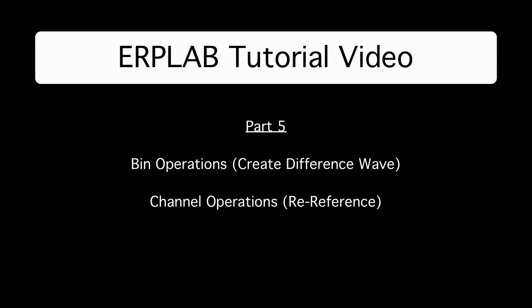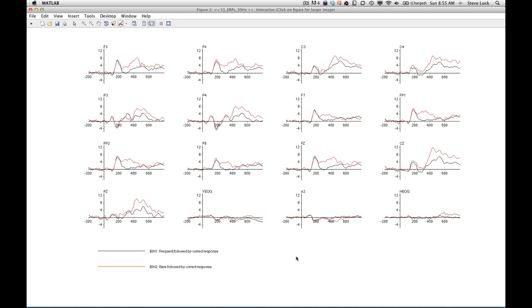Our next step is to make a difference wave. So this is a traditional oddball paradigm, and we've got rare stimuli, those are the red lines, and frequent stimuli, those are the black lines. And it's often useful to make a rare minus frequent difference wave. So let's see how to do that.